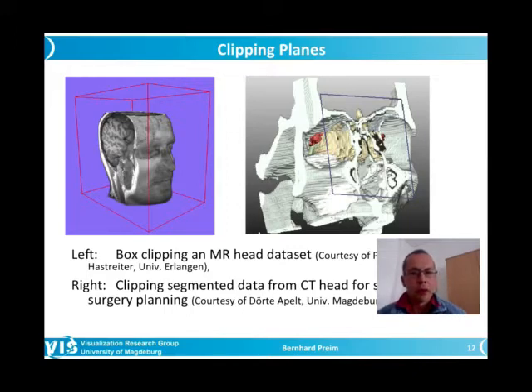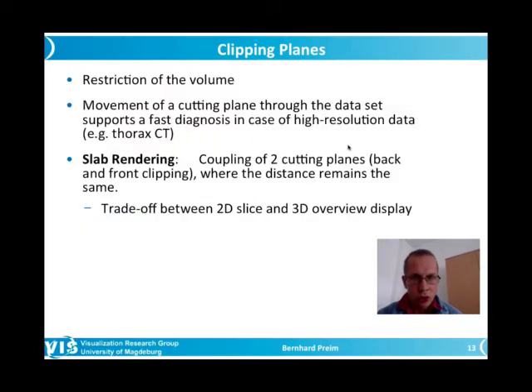That was really done here for surgical planning. The yellow structures here are swellings in the nasal areas, in the sinus areas of the nose, and the patient could not be treated with drugs alone. That was not sufficient, and he needs surgery. Surgery in this particular example was difficult because the regions where the swelling needs to be removed surgically are quite close to the optical nerve. You can imagine that damaging the optical nerve is something that should not happen in surgery. So therefore that was planned.